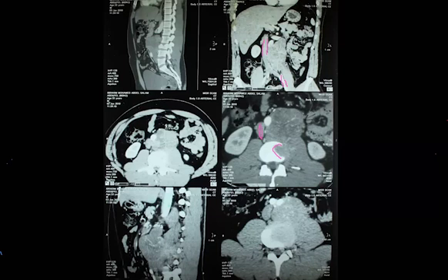Yes. The history of this man, he was 35 years old, or he was 40 years old. He had an orchidectomy a few months earlier, and he was already on chemotherapy. He was receiving cisplatin, and he already had the feeling of pins and needles in both lower limbs. And this was his CT a few months after the successful orchidectomy through the groin. So lymph nodes. Do you think abscess? Was it psoas abscess?